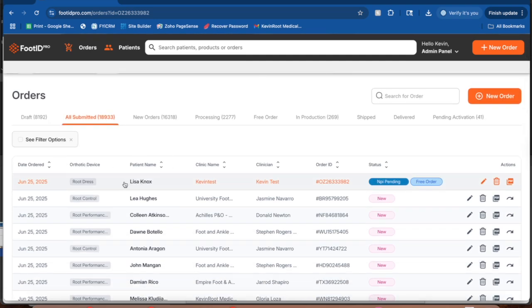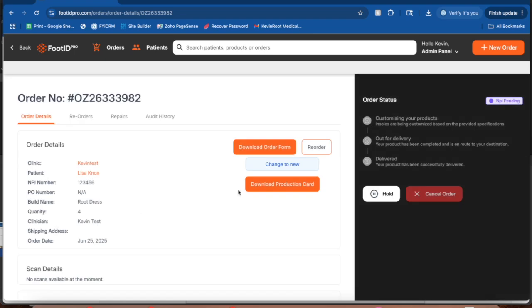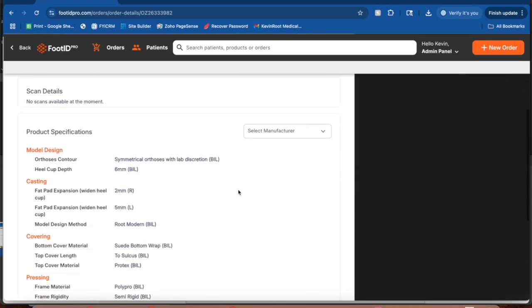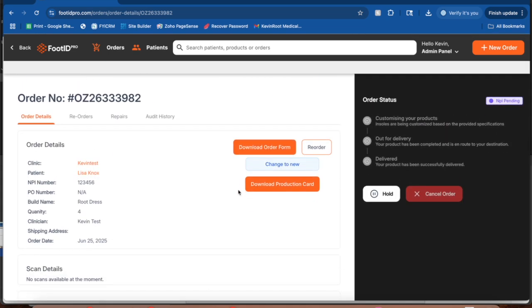And here I'm able to review my order that's been processed. And that is a quick tutorial on how to use FootID Pro.